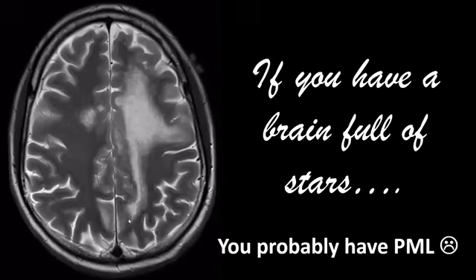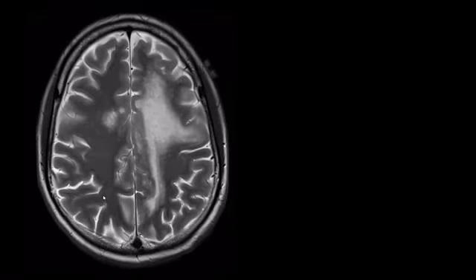And if you look surrounding the lesion, you see a lot of very small dots, and they look a bit like stars. They look like a Milky Way. If you see that, well, that's a sign of progressive multifocal leukoencephalopathy, which is an opportunistic viral infection that is typically seen in immunocompromised patients, typically HIV patients.